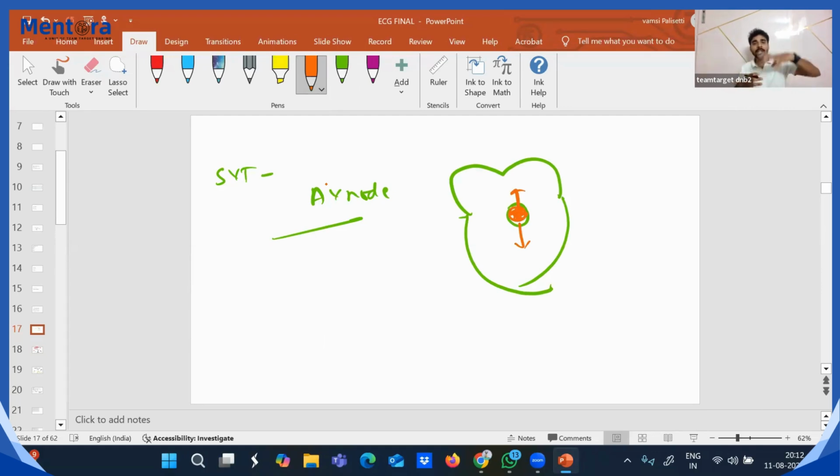So normally in a normal heart, atria will depolarize, then there is a gap of PR interval, then ventricle depolarizes, so the QRS complex comes in the ECG. But in this scenario where the AV node is generating impulses, atria and ventricle contract simultaneously. So in the ECG, you cannot detect the P wave, but the atrial P wave is present, it is submerged in the QRS complex. That's why you cannot see the P wave.